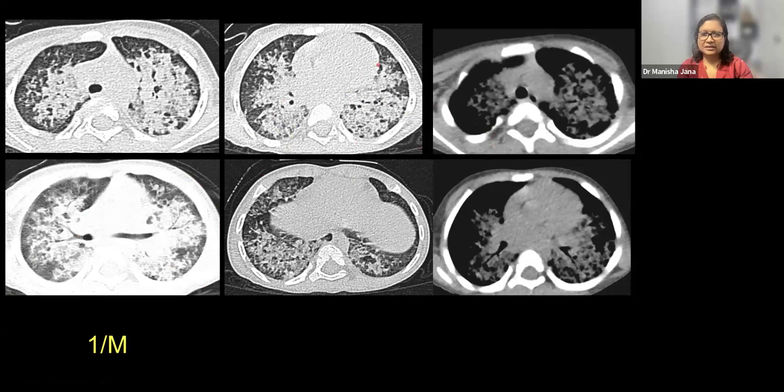And another disease entity we should also think of in this kind of appearance is lentil hypersensitivity, which has been shown by Cabra sir here only. And lentil antigen positivity was detected. And in that lentil hypersensitivity also, there is a typical weaning history with forceful dal feeding, and CT appearance of very dense consolidations. These are the imaging findings.